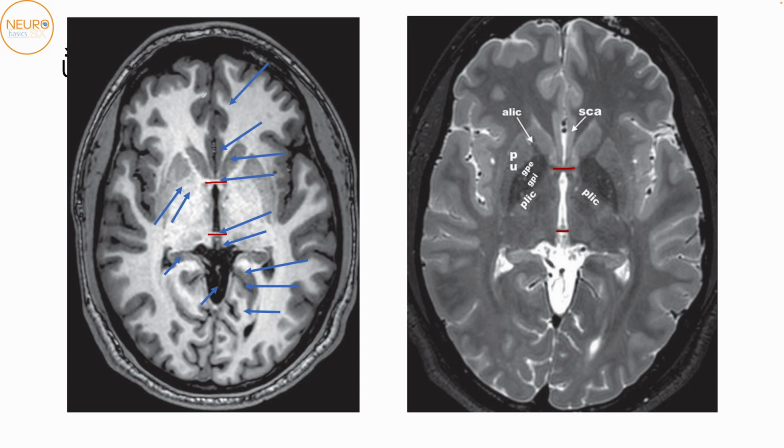Okay, we have come more inferiorly, so we're now able to clearly make out the third ventricle over here. Okay, so now at the level of the third ventricle, we do not have the obvious frontal gyri anymore. We do not have the superior frontal and the middle and the inferior frontal gyri anymore. Now we have this gyrus rectus. This would be the cingulate over here, the cingulate sulcus over here. Okay, this here is known as the subcallosal area.